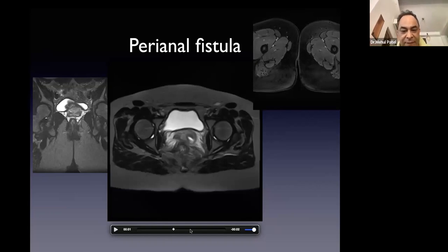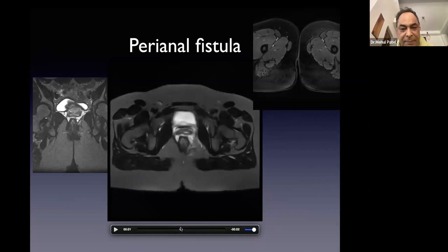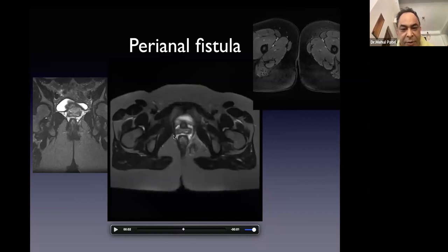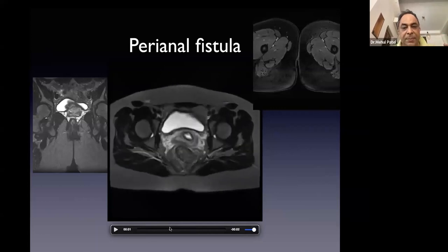Then if we come slightly further down, again bladder. This is pectineus. So here is your levator plate. Can you see the levator plate? External sphincter going up as the levator ani. These are the adductors. So this is pectineus, right? So going up in the pelvis, three organs: bladder, uterus, rectum.